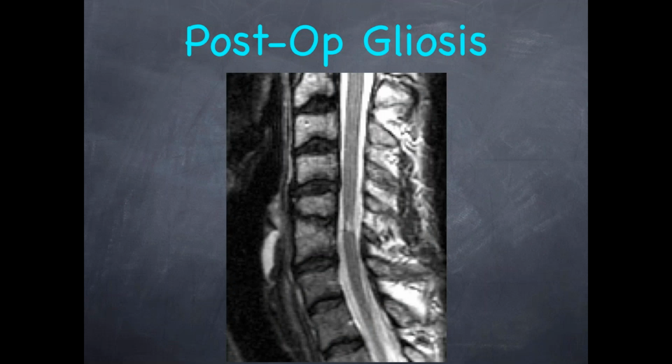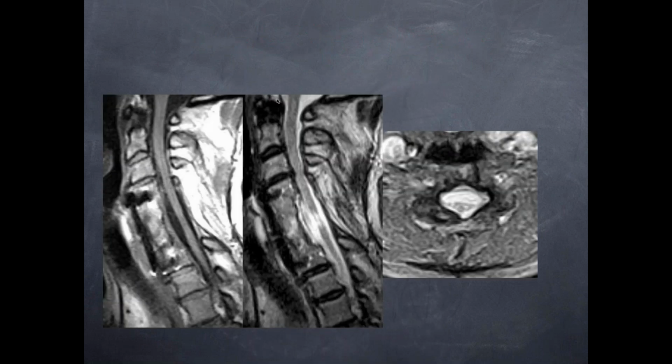Okay, so yesterday I think we ended up showing this case of postoperative gliosis. So why don't we start with this case today? Okay, so sagittal and axial images of the cervical spine.